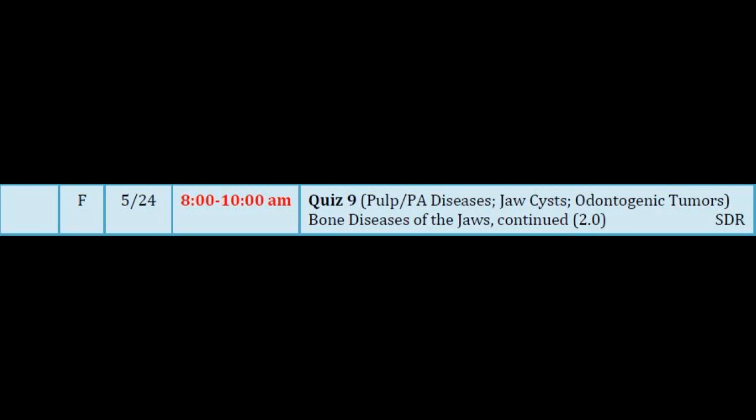The residual trabeculation of the bone in front or behind it. But if you did a CBCT on that, the lesion would be all lucid. No bone in it. So it has that nice punched out border, and it's expansile.